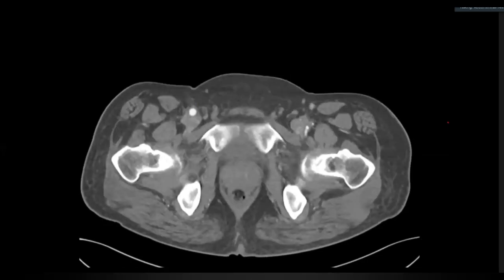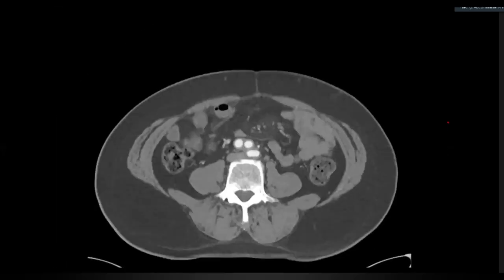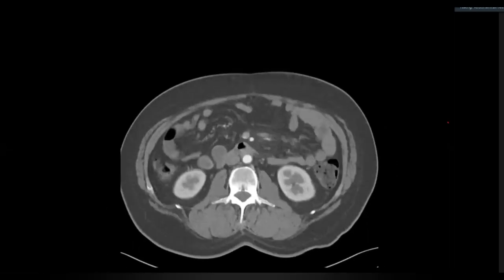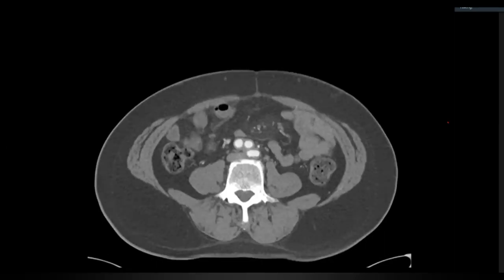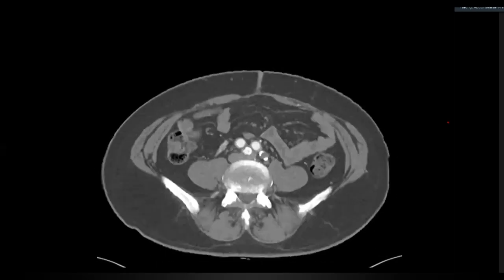Okay, I'm going to go back up again. So focus only on the artery. So start here, down, down, down, down. Okay, tell me about this image. So there is dilatation of a branch of the aorta at the level of the kidney at its origin, and then in the lower sections, it is dividing into two vessels, right and left. And the left vessel shows a filling defect within its middle part.